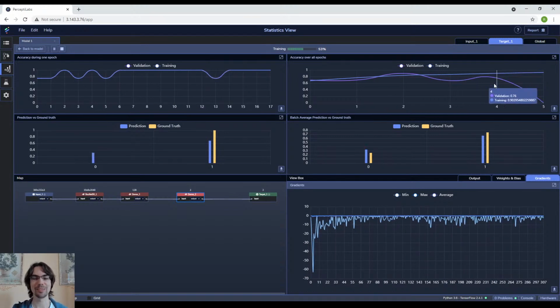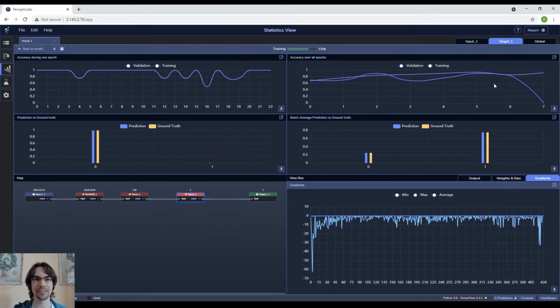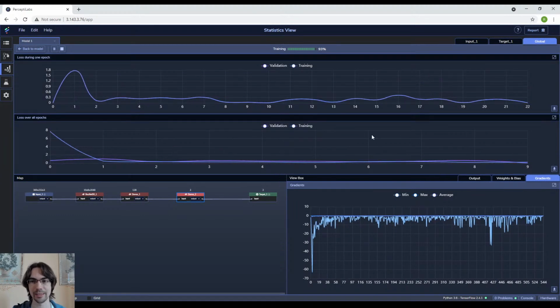Looking between different model versions is something else that's coming out, probably late summer around there, where we'll add version control. So you can see the different versions of your model. You can see how long they took to train, you can see the accuracy and the loss. And you can also swap between the versions. So it's going to be very easy to do exactly what I'm doing now, but without using Notepad and having to write everything down.